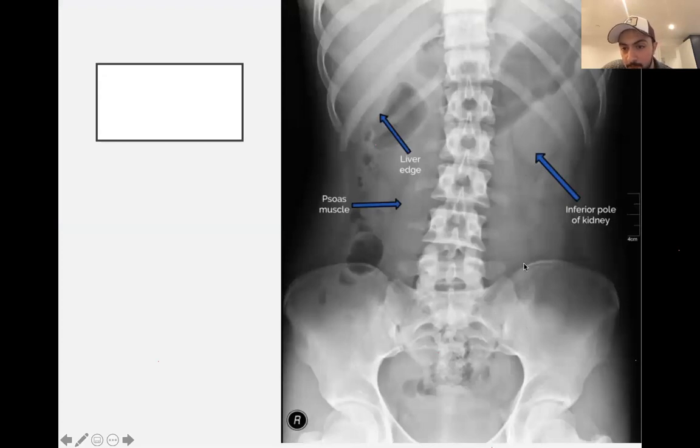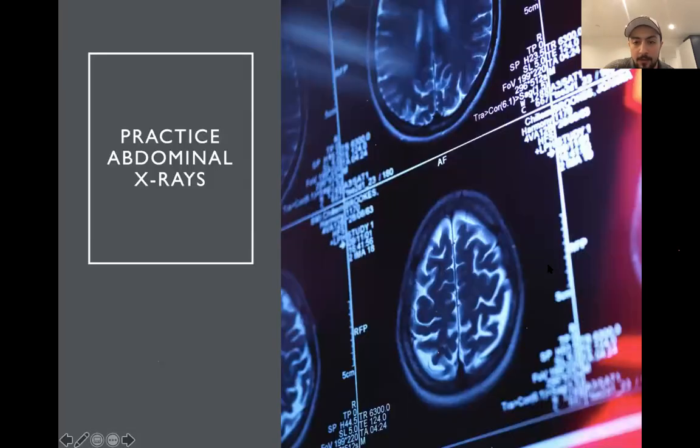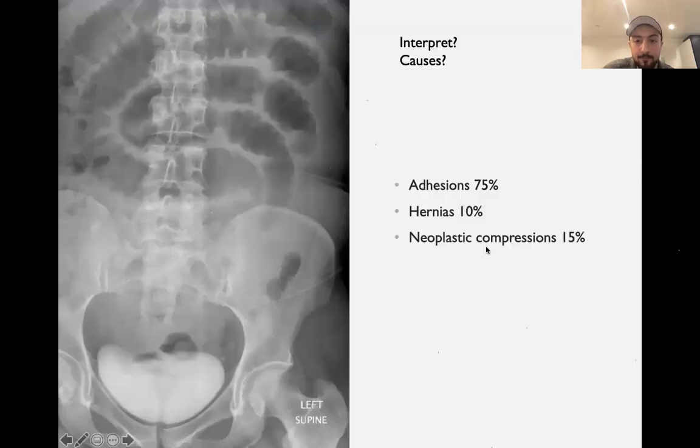And these are obviously the pelvic bones, the vertebra, coccyx, and sorry, that's the sacrum. You can see the rest of it. And that's the large intestine. You can see some food inside of it in here, which is why it appears white. So you can see the large intestines in here clearly. So again, we're going to practice in these ones. So that gives away the answer, unfortunately, I think.